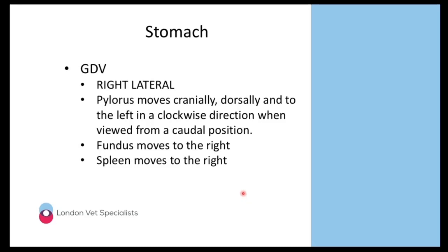Moving on to the stomach. So a GDV, a gastric dilation volvulus, is not something that many of us look forward to, particularly if we're on call and it's a Friday night. If you have a patient that you suspect has a GDV, and typically these are larger dogs, they might have had a large meal just before the owners have called the practice to say that their dog is now looking quite bloated and unproductively retching.